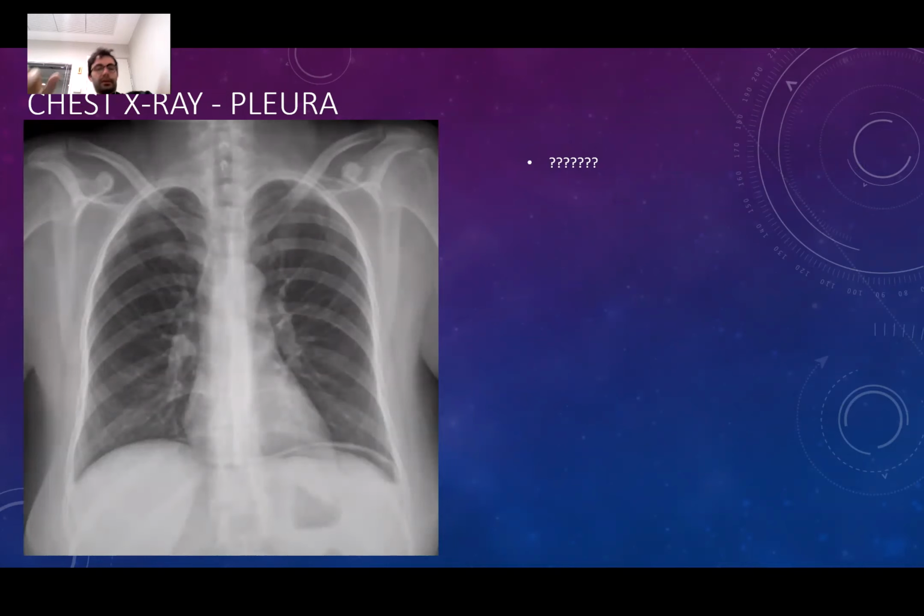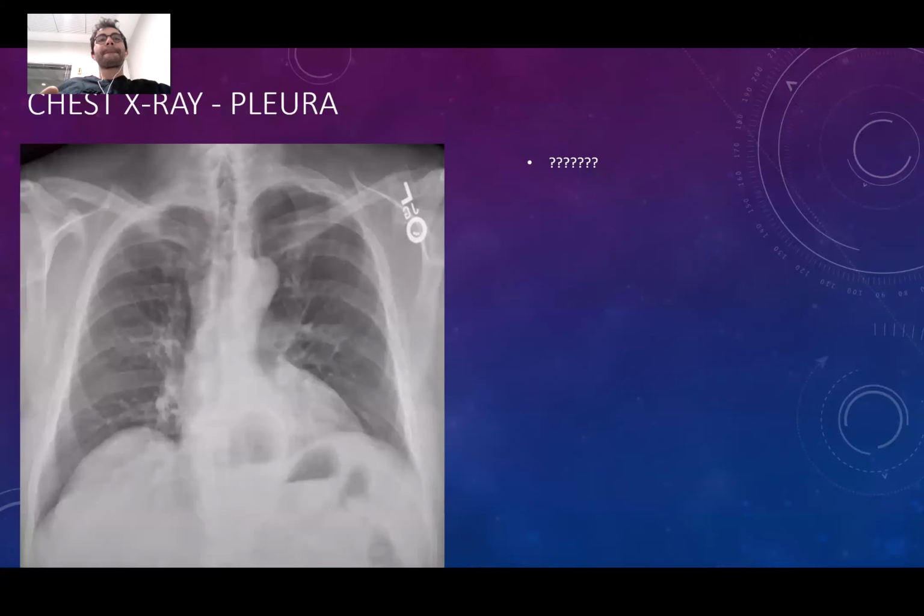Can you see any abnormality here, people? When we are looking at the pleural linings, we should be looking below the pleura as well. There's some free air under the diaphragm on the left side. It really doesn't look like stomach gas. Stomach gas is here. It's usually widespread, and the contour is the diaphragm, so there's free air under the diaphragm. This is a very important diagnosis. I think most of you had diagnosed this before I told you. Please do not miss it.